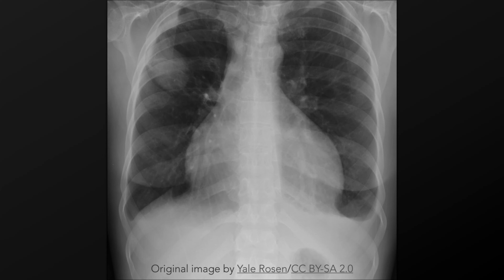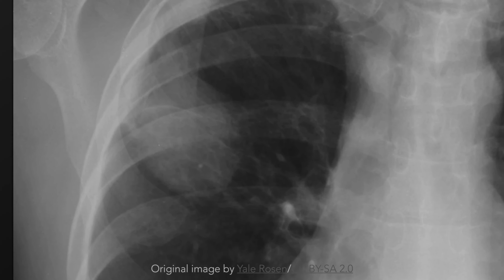Aspergilloma is often manifest radiographically as a focal, ovoid, and non-spiculated opacity, more commonly located in the upper lobes. If liquefaction necrosis occurs, then there may be a central area of radiolucency. A thin-walled area of radiolucency can be found above or surrounding a cavitating aspergilloma, a finding referred to as the air crescent sign. A similar finding is present when an aspergilloma forms within a pre-existing cavity.